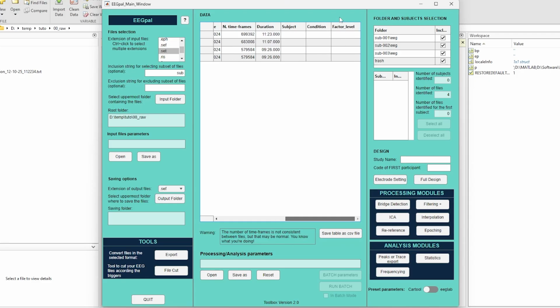These two columns will be useful in the statistical analysis, and we will see that in a later video.